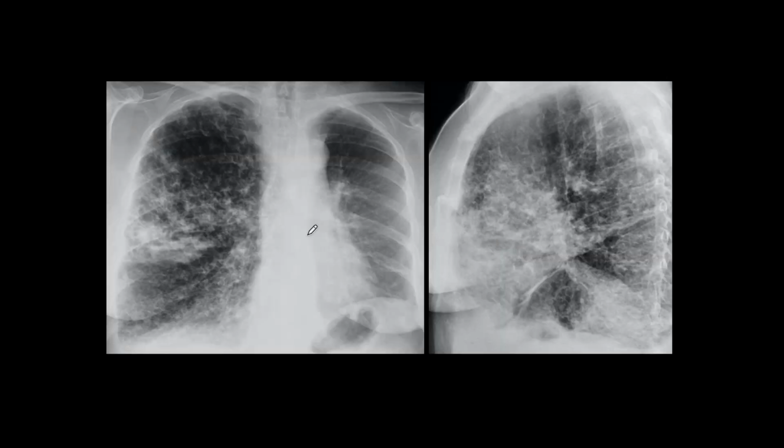This sign may be useful in the presence of bizarre appearances of the chest, like in this patient who has a normal left chest, quite abnormal, apparently bronchiectasis all over the right lung. And when you see the lateral, you see that it has a transverse sternotomy, and the bizarre appearance is simply due to a unilateral left lung transplantation. And this is a useful tip, especially if you are taking a diploma examination, you can surprise your examiner.